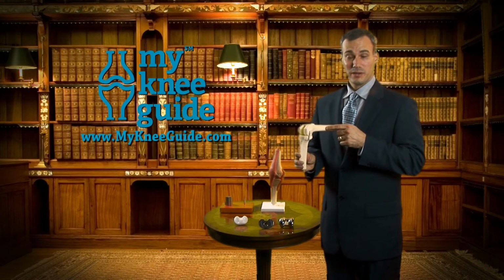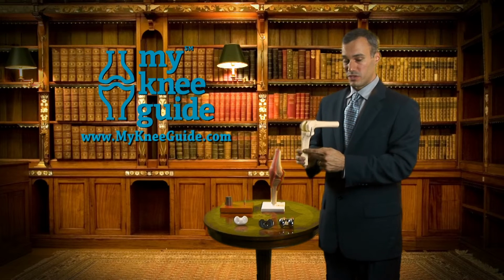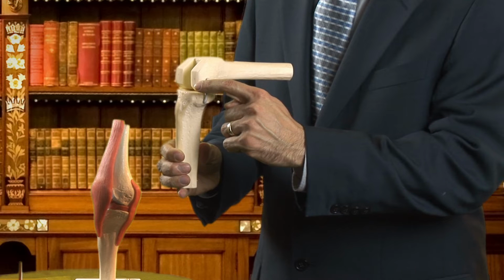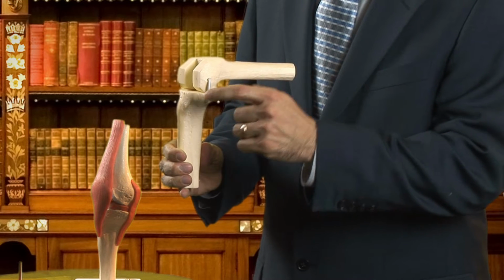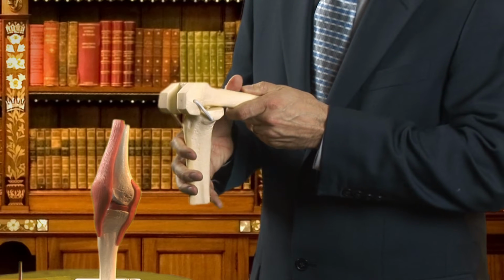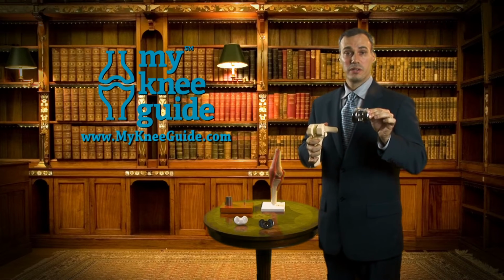Let's take a look at this model. This is the thigh bone, this is the shin bone. You can see that we have fashioned the ends of the bone here for acceptance of the new prosthesis. Let's bring the thigh bone to the front, and we can take the new metal prosthesis that's going to fit on the end.